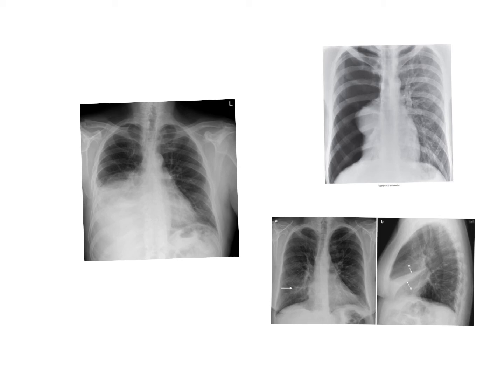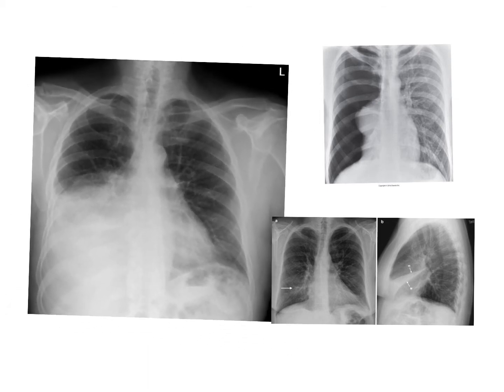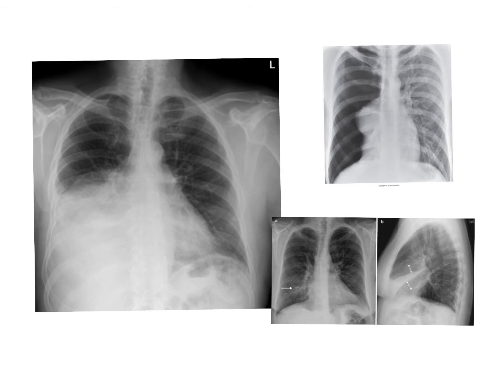All right, let's take a quick look at a few chest x-rays so that we can identify some respiratory pathologies. The first one we're going to look at is this one. And the pathology that we're looking at on this x-ray is pleural effusion.